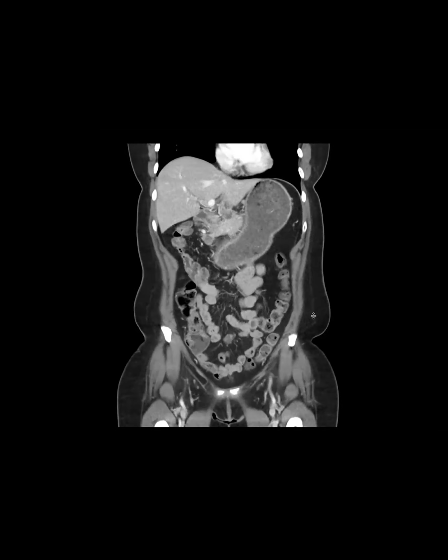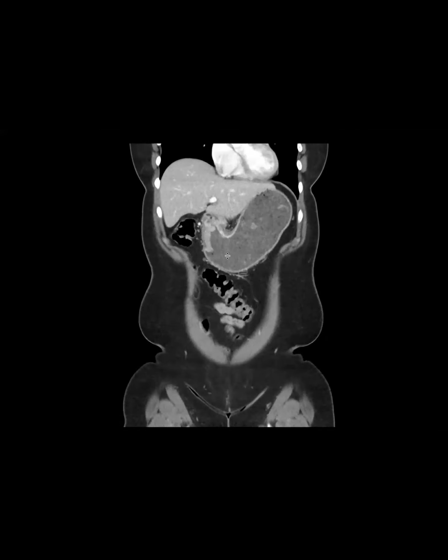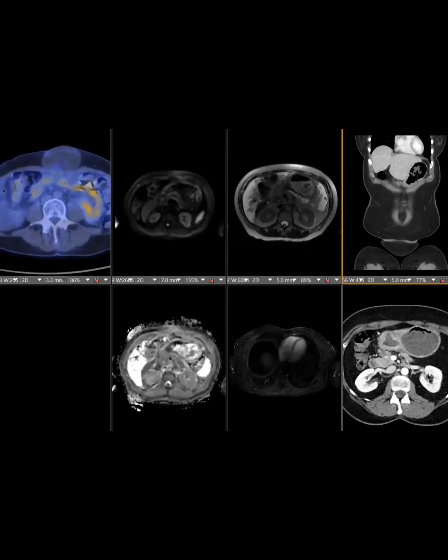I was going to say because we use Volumen, but this looks like a bunch of food and stuff. Look at all the debris. So I think it was probably that. This was multiple years ago, the pre-treatment. And then the patient had chemotherapy, radiation.